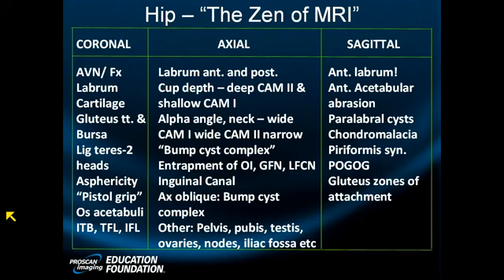So I'm going to start out with my quick bilateral view of the pelvis. It is a 16-year-old. He's a high school runner. He's got persistent hip pain. So let's look at how this study was done. The axials are obtained obliquely along the long axis of the femoral neck through the calcar.